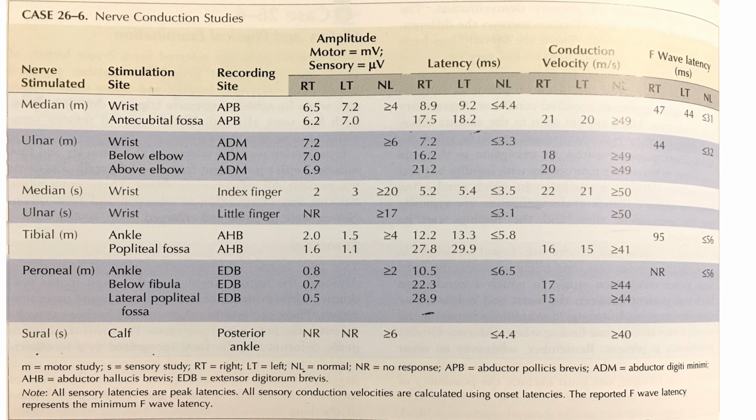So, these were the typical examples that we used to elaborate how the different forms of neuropathies, based on the pathology, would look in a chart.